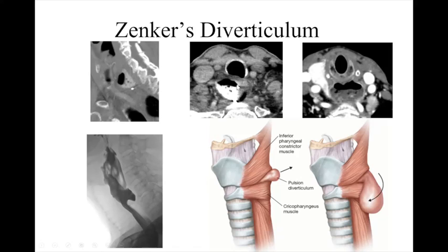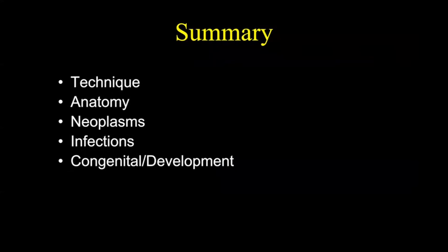Now, you can look at this and say, wow, it sure as heck looks like an abscess, but realize you have to put everything in the clinical context. And in this particular case, the patient had no fever. They had signs of difficulty swallowing and reflux. So as a result, we can make the diagnosis and feel very comfortable that we're dealing with a Zenker's diverticulum.